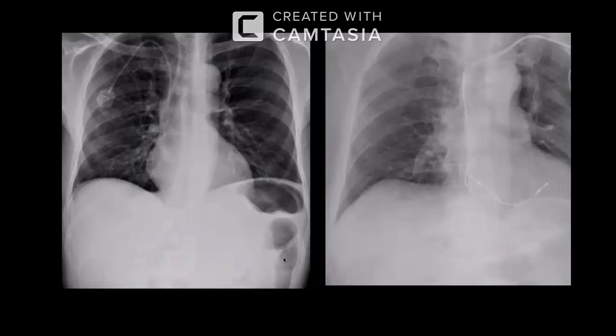It could be a liver lesion, or a hydatid cyst, or any abnormality in the gallbladder, as the patient is presenting with jaundice. So it could be the gallbladder. I would convey my findings to the referring doctor, and this patient would need further evaluation with a CT scan to characterize this area better.